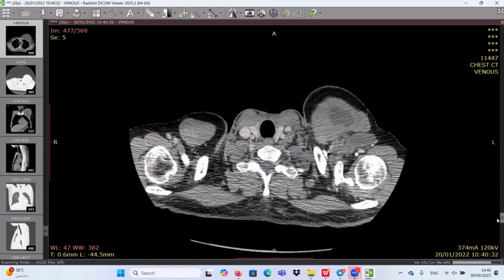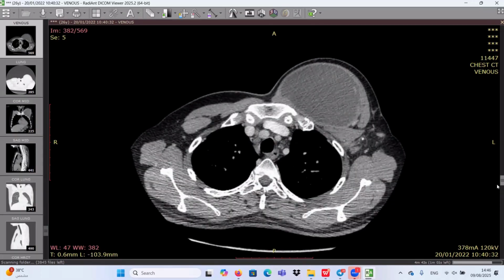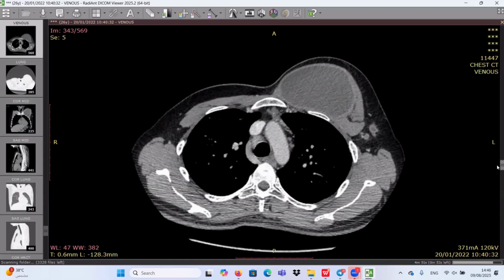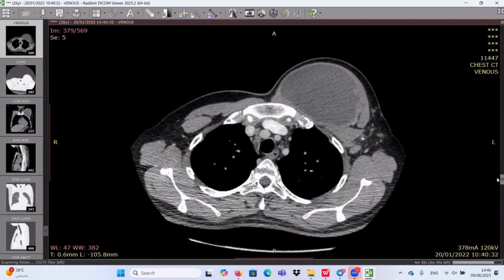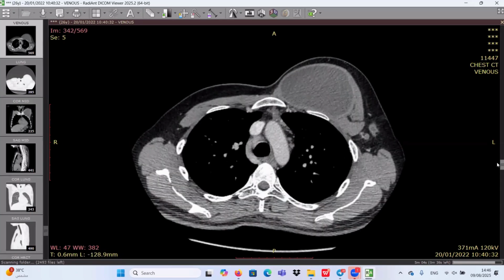Are you still thinking of neoplastic mass? No, sir. Now, because of the predominant necrotic nature of the nodes and the mass, I am thinking along the lines of granulomatous infection, like tuberculosis would be my first differential. I would ask for any previous history of cough or fever or low-grade fever, or I would correlate with any history of weight loss the patient complains of.